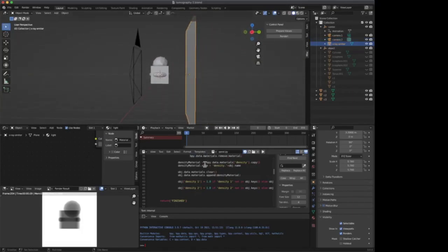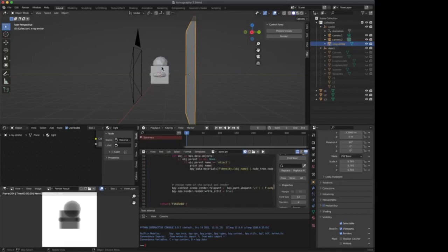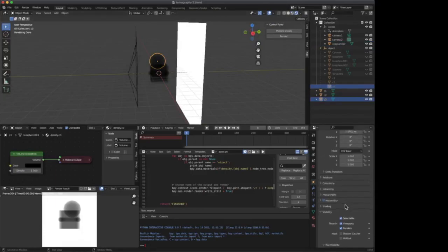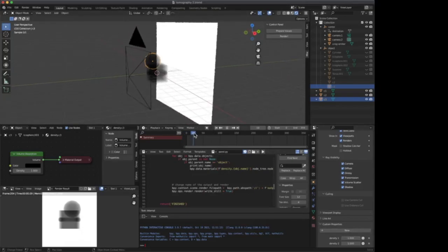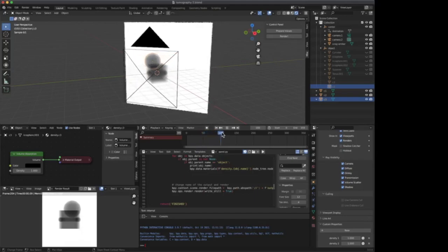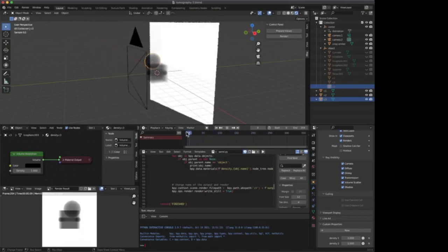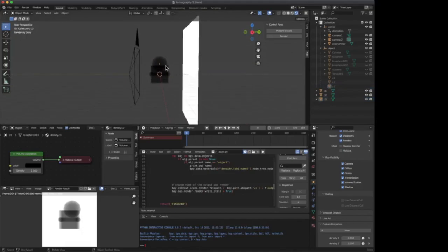Furthermore, we can use the built-in Python system in Blender to emulate behaviors. For instance, to simulate multi-energy systems, we can use the custom properties of each object and set different densities for each camera. We can then generate, for each angle, a different image corresponding to a specific wavelength that will correspond to a specific density in each object. In fact, we can even define emission and absorption curves so that the final image for that camera takes into account the whole spectrum.